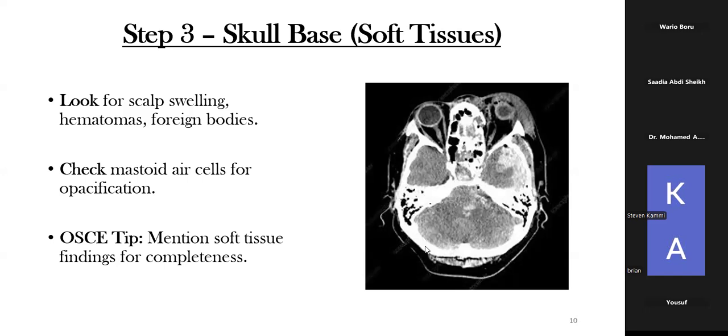But at your level, if it's a station for investigation and you have a scan, it can be an X-ray. And remember, it has to be standard, so they have to find one that everyone should be able to answer. So you're given one scan. If you go in a systematic manner, you're able to go through it very well.